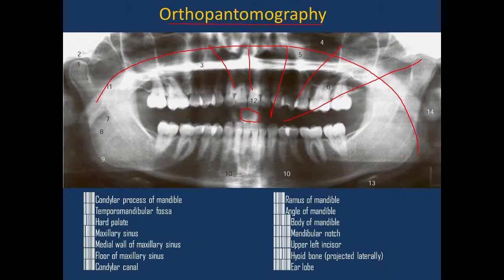and makes all teeth visible. What we see in this picture: this is of course the dentes incisivi, and these are the dentes canini here and here and here. And we also see the radix dentis and even the cavity of the dentis. Here there are no molars, only the last molars here, and here I think that is after a surgical operation, when it was taken out of the alveolus.